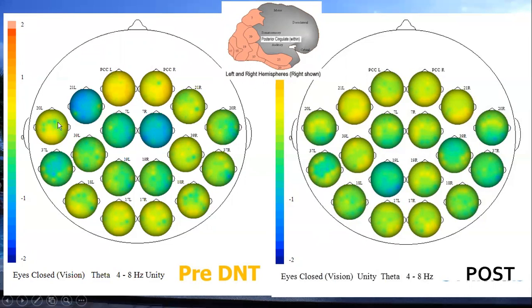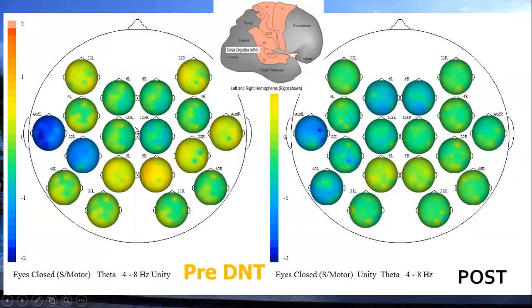And sometimes it's trust and suspicion issues there. But a lot of that's got normalized there. Here's the middle of the head. You can see up here what we're talking about, these regions. Area 32 deals with what I call mind reading, trying to figure out what other people are thinking. It's understanding the differences of others, contextual rules. You can see completely normalized there, beautiful.